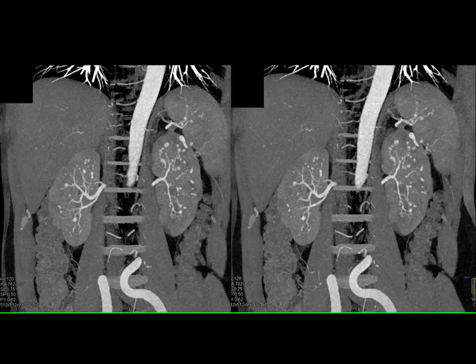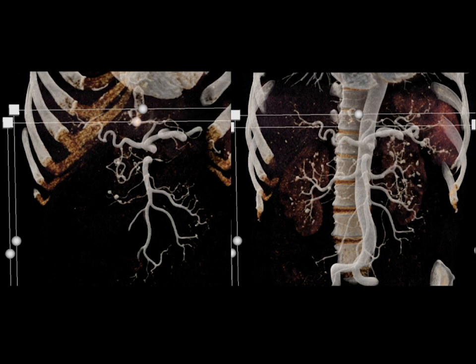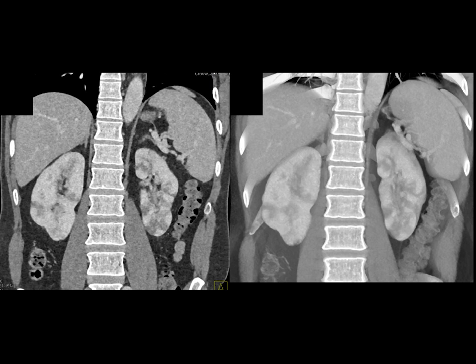That's classic polyarteritis nodosa. There also are, by the way, small aneurysms off the patient's SMA, as well as the splenic artery, as well as the celiac. Just a beautiful example of polyarteritis nodosa with multiple zones of vascular involvement. It also shows how nicely you see it when you go to later phase imaging. You see the sequela of small infarcts or perfusion changes, but you can't make the diagnosis from those appearances.